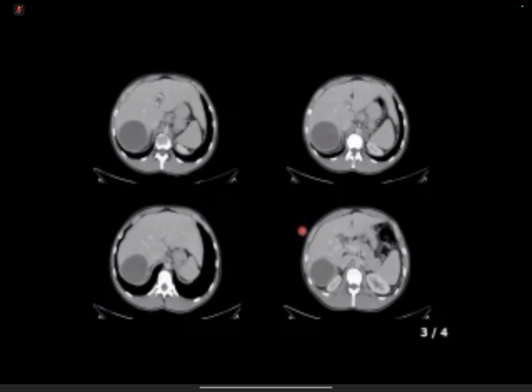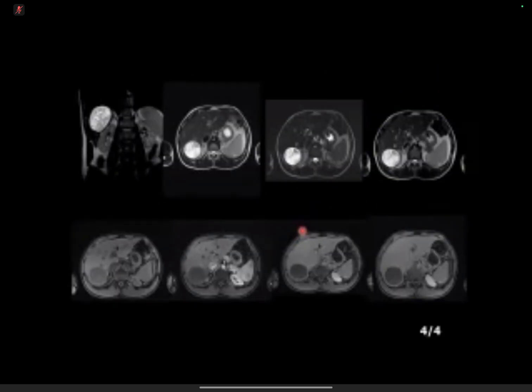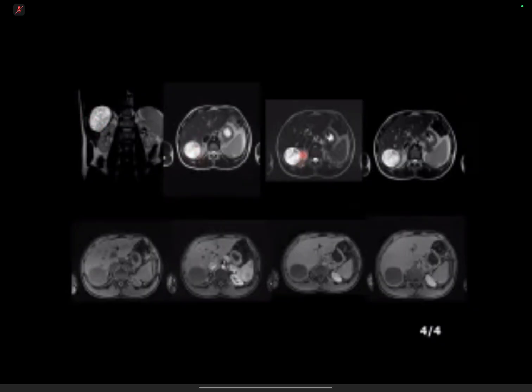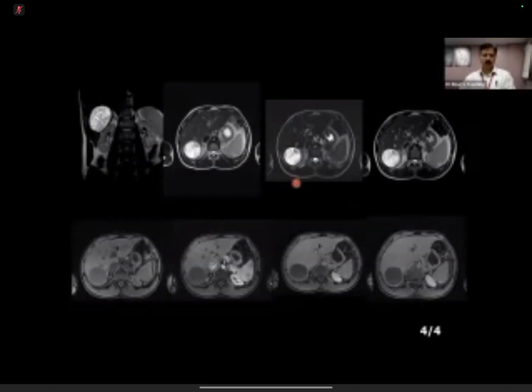Okay. So imaging-wise, would you do anything else? Or would you do an MR? So this is the MR. Because of time factor, I'll ask you a leading question: confirmed or not? Yes, I think so, confirmed. Okay, so these are internal membranes. Please remember, hydatid cyst. Thank you, candidate 4.